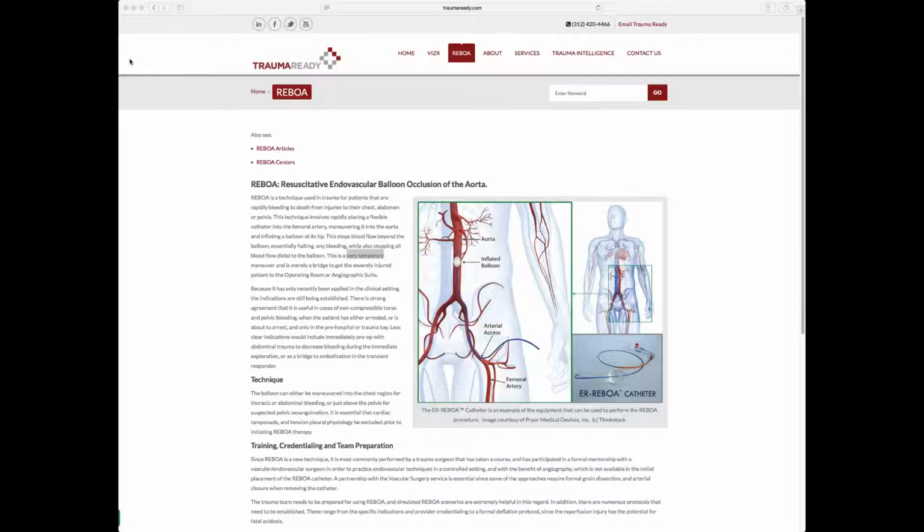Here's another case. Maybe Jeff can tutor me in this case because it's an interesting case of a congenital problem. Let's look at the scout. We still see your REBOA thing. Got it. Yeah, you have to switch it on the GoToMeeting. Here we go. There we go.